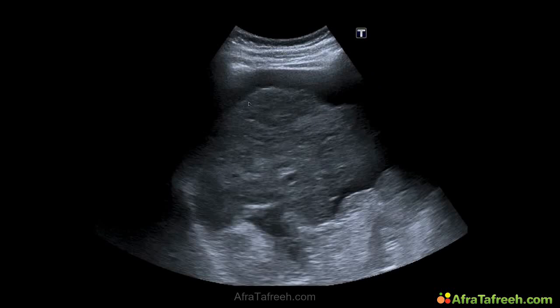Also in the next picture, let's take a look if we can find these features too. Again, we got the irregular capsular contour, the inhomogeneous parenchyma of the liver, and also here this small dark area around the liver, which is ascites.